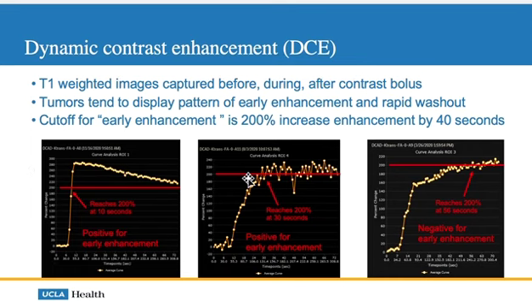All of this data goes into the radiologist's interpretation of the PI-RADS grading of a lesion. And because we're not really going to get into the details of that, it's a little bit less clinically useful for you as a clinician, just looking at these images and getting a sense of what's going on in your MRI. But I think it's worthwhile understanding what this means and how they measure this. So you will not be measuring this yourself. This will be provided to you.